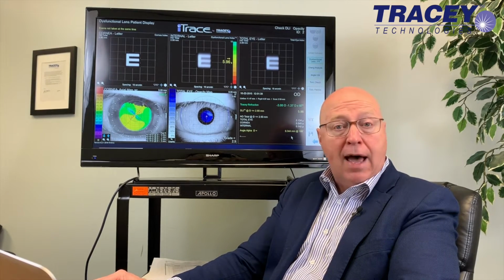The second thing you look at is optical alignment. If this is over 0.5, it'll turn red, and it suggests a multifocal is not a good idea. It won't center on the visual axis, and you may have a risk of dysphotopsias. So what else do you do?